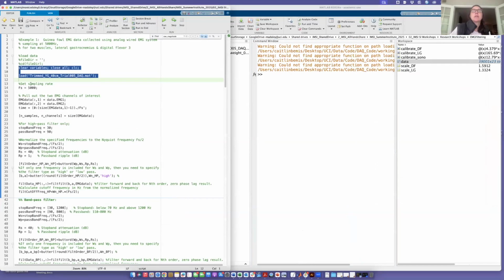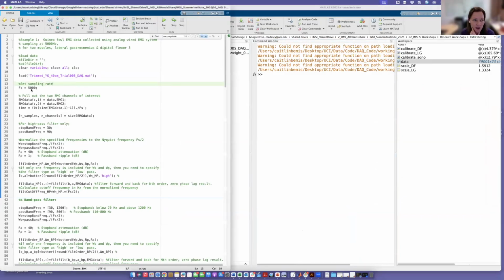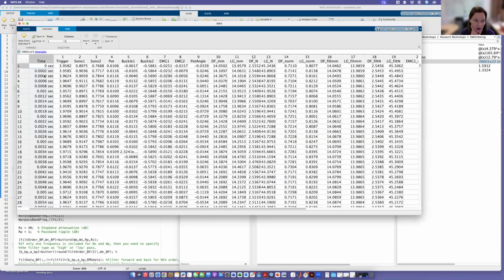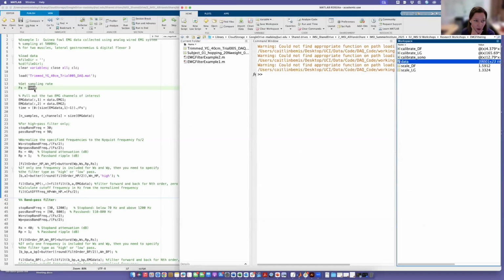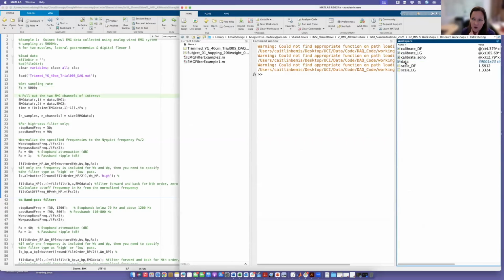Got it. Okay. So you should always confirm this before hard coding a variable, but you would confirm it in this case by looking at the time vector. I know that the sample frequency is 5,000 hertz here. In some cases, you can calculate it directly from the time vector, but sometimes it's not recorded, so you need to know it from your notebook or something like that.